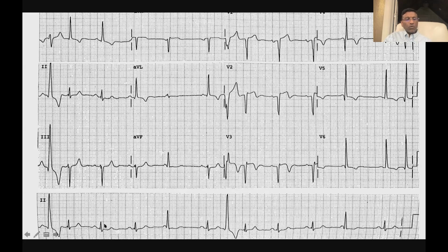So one might ask, well, if you just made a case to say that this special condition called parasystole means that a PVC focus is protected and keeps firing at its own rate, kind of unhindered or unimpacted by the conducted complexes, why did it not fire here? Well, it did not have a chance because the ventricle was already refractory, because you have a normally conducted beat here.